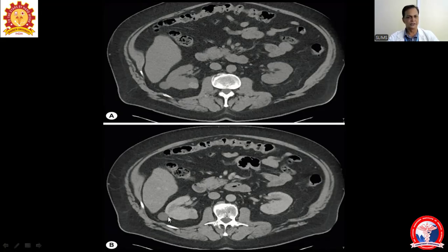This is an exophytic cyst additionally. So this is a cyst where the density will be near fluid, near water density, and the kidney we saw is isodense, close to that density only. And here we are seeing one more spherical area, which is partially exophytic, and it is cortical exophytic like that. So this is also a spherical area.